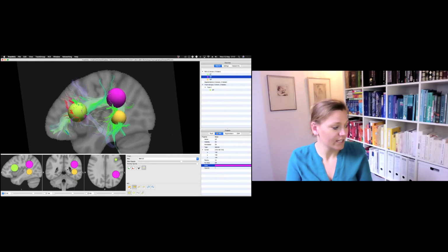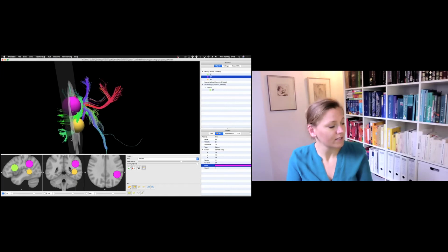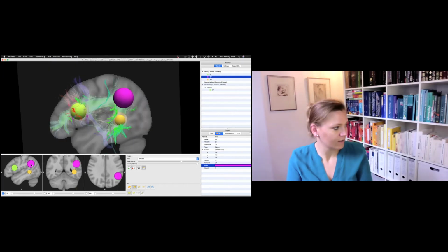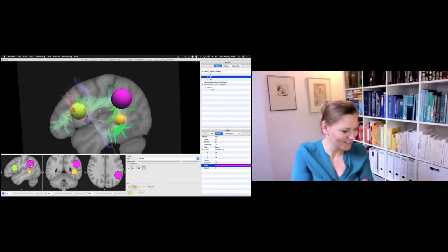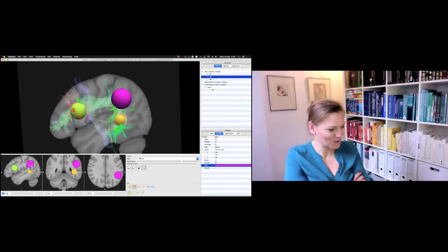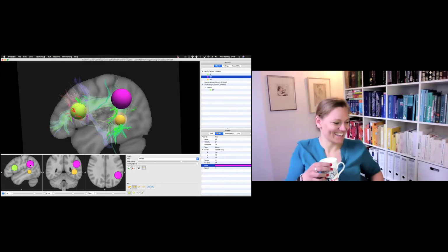And you can do that either on the coronal or the axial slice. And you basically just grab it and pull it out a bit. It's better still touching it a little bit. Okay, is everyone happy? Can I just get some yeses or nos just to see you're still with me? Ah, lovely, fantastic.